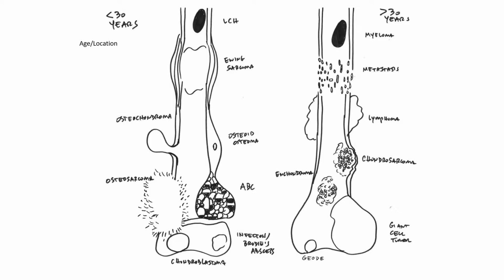Another correlate by histology is a cartilage tumor. Osteochondroma typically occurs in a patient less than 30. Chondrosarcoma we see in patients greater than 30. The difference here is that an osteochondroma is confluent with the intramedullary canal. It also is a developmental tumor that occurs as a growth plate rest turns 90 degrees to its normal growth pattern and creates a stalk of bone growing off the bone.